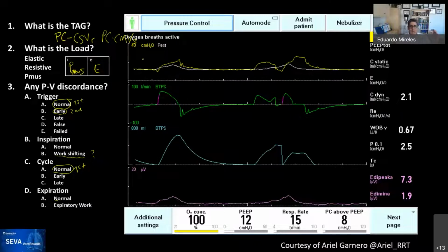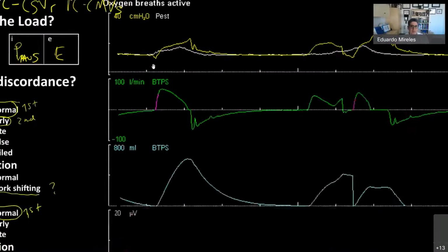Let's start with the first breath. Let's walk together through it. If this was NAVA, it triggers by either the EDI, the electrical activity of the diaphragm, or the flow trigger or pressure trigger, whichever you activated, on a first come basis. In this case, you Stephen alluded to this, you see the changing color of the flow signal. And on top, actually I'm going to amplify this for a second. You can see it better there, Samir?